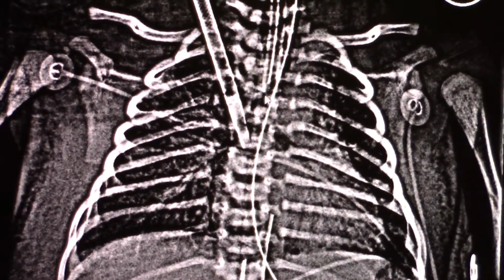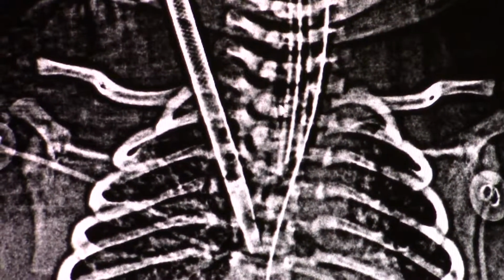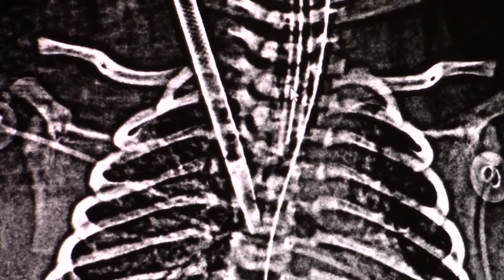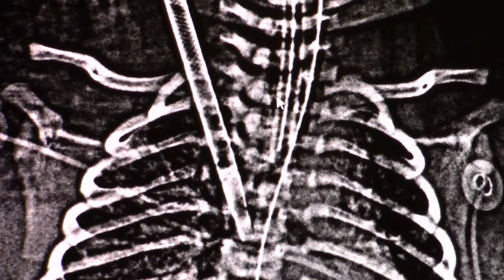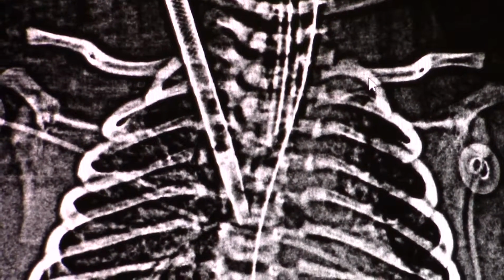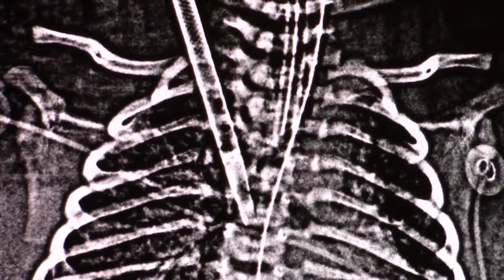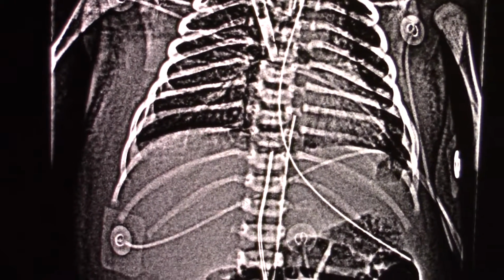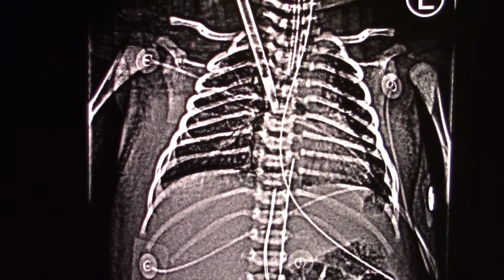So first we're going to find out where this tube is. You find the first rib and you can connect it to T1, and this will be the hardest part of this job, trying to find where T1 is. It's sometimes hard to find the difference between C7 and T1, but that's one way: you find the first rib, connect it to the vertebra, that's T1. If you want to double check yourself, you can come down to the floating rib, which is 12, which on this kit doesn't appear very well, it's right here, and count your way back up to verify that. So we're going to find 1.